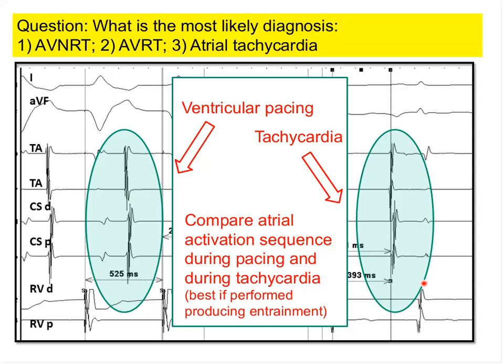Just this change tells us that the atrial activation is going through a different structure, okay?